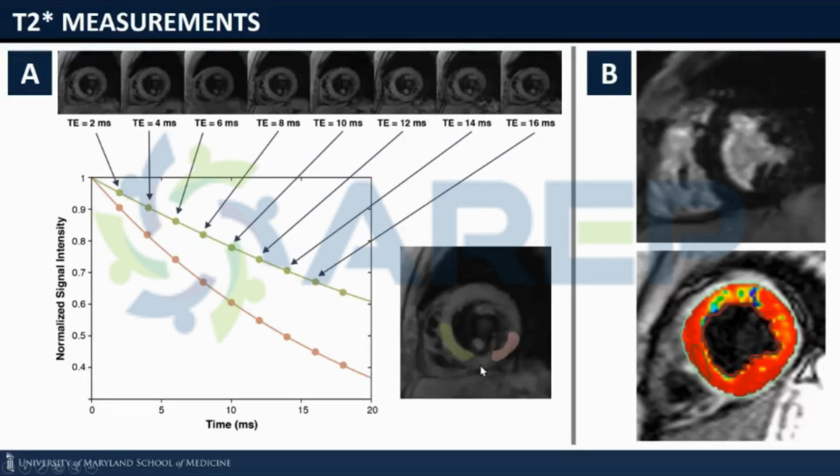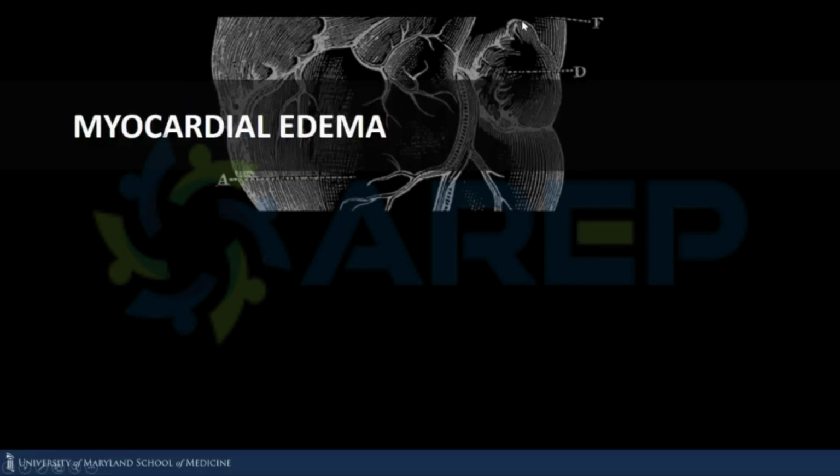We're looking at a portion of the heart. We're looking at 2 segments, near the septum and more lateral aspects. Again, for any parametric mapping technique, we do multiple images over time. And here we see the curves for both of those areas. We see the curve for this lateral aspect of the heart is very low, suggesting that you have a focal area of iron deposition. In patient B, we see that there is almost diffuse abnormality of the myocardium. As we see here, this is someone with severe iron overload.